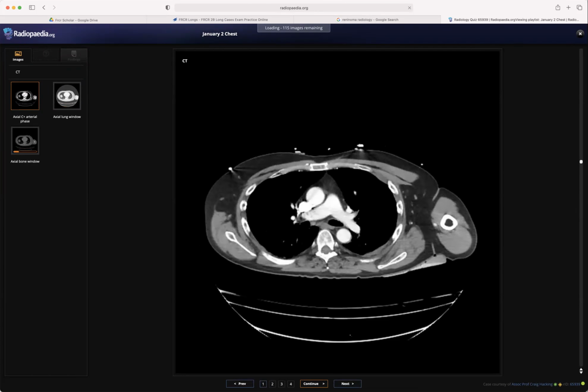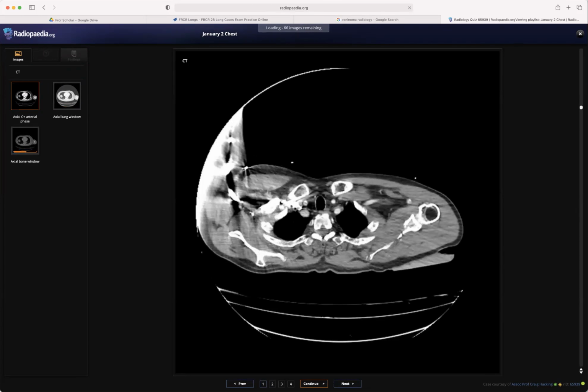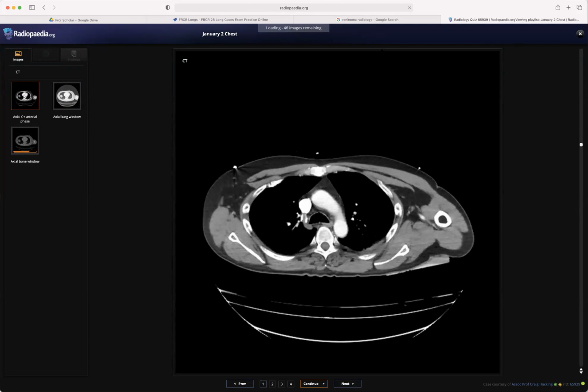I'm provided with the post-contrast images of the thorax. Would you like to scroll it, Dr. Vijaya? I can't see your name. You can ask by going to the view option and asking for request remote control. Did you receive it?